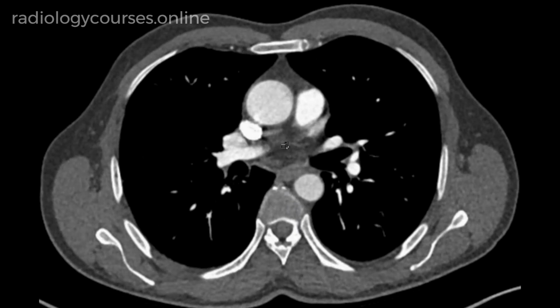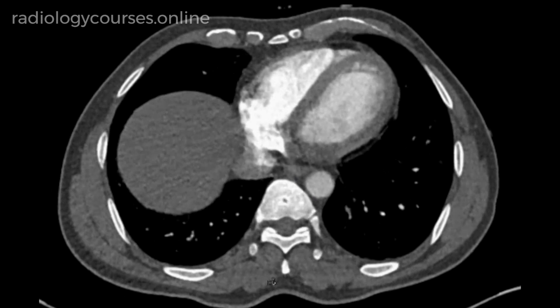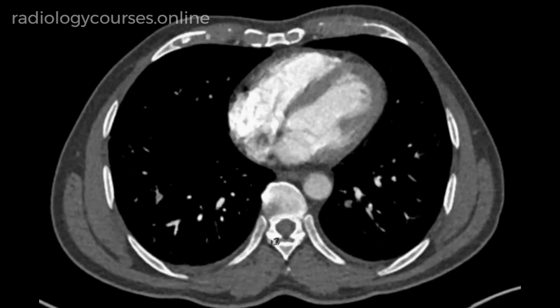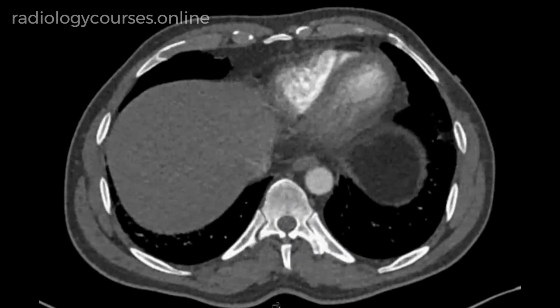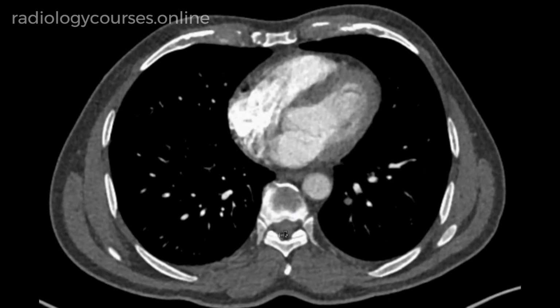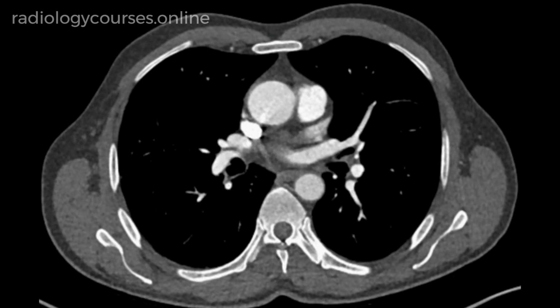In summary, here is a case of isolated segmental and subsegmental pulmonary thromboembolism in both lower lobes. And I've shown here for the residents how to look for these small or subtle but not so infrequent pulmonary thromboembolism.